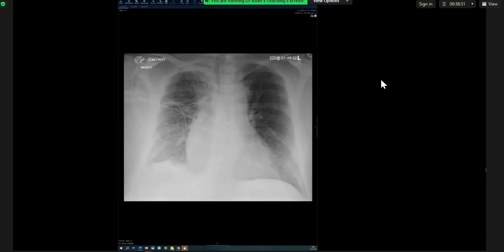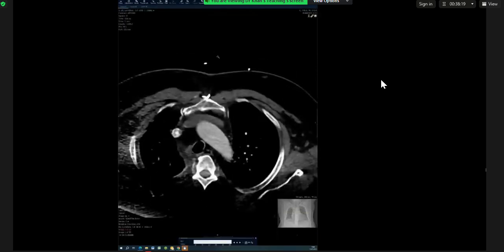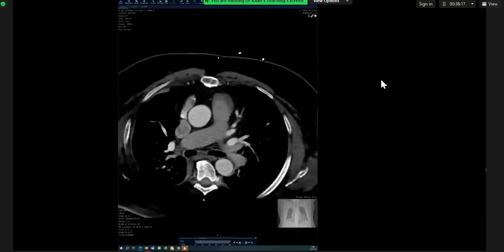It's one trick sometimes we use just to make sure we don't miss a life-threatening abnormality, but saying it doesn't seem as smart as we want ourselves to sound. So this one is a heart failure patient with a sternotomy. This patient has an abnormal echo and is deteriorating quite quickly. He has had previous heart surgery for an aortic valve replacement. Let's see if you can spot the abnormality.